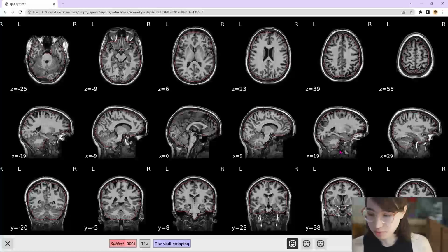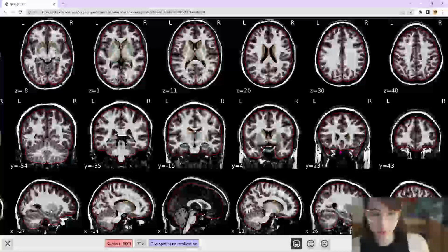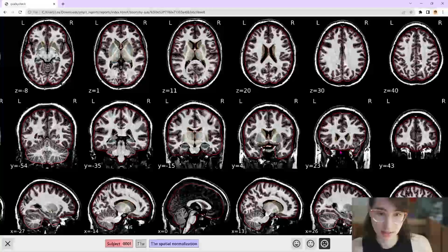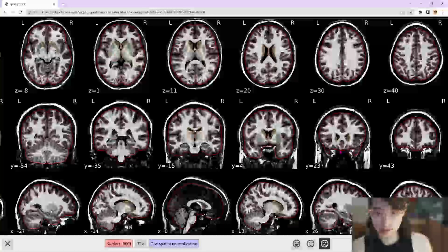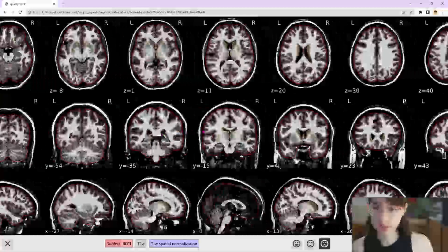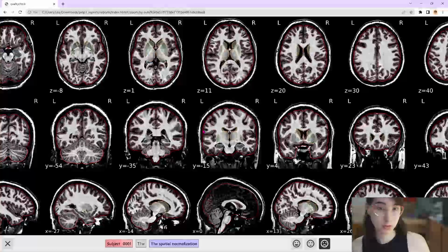So actually to do this really fast, I can work on my keyboard, and I can use D to jump to the next image. And then I can use W to give it a good rating, S to give it uncertain, and X to give it a bad rating. And I can also use A to go back. So it's W, A, S, D, and X are the keys that work with this interface. And this is also all documented in the quality control manual. There's also examples for good images and bad images, what to exclude, what to include, what our recommendations are for those.